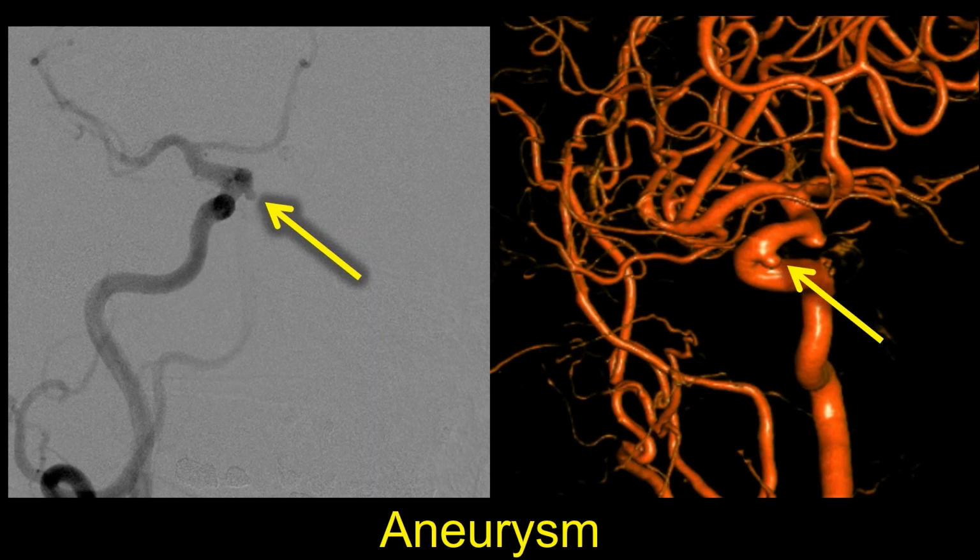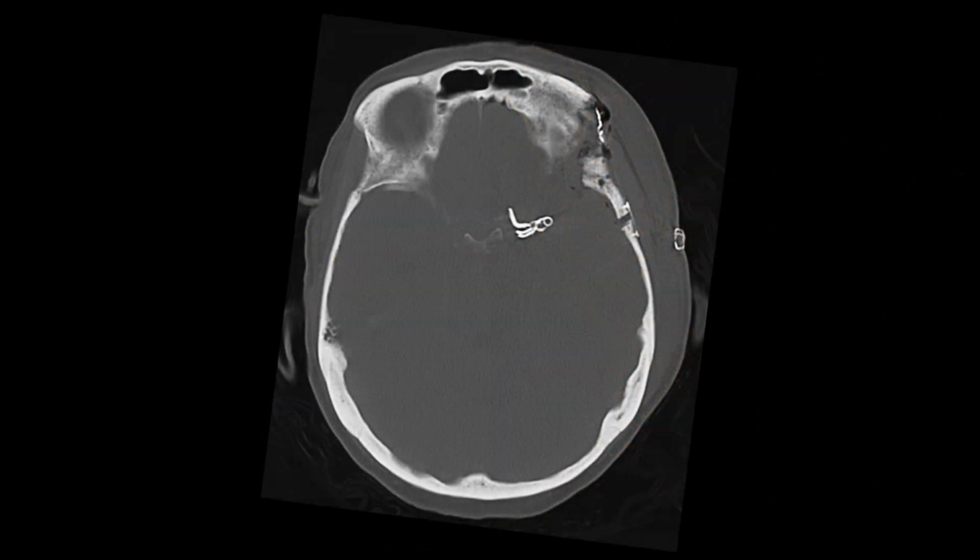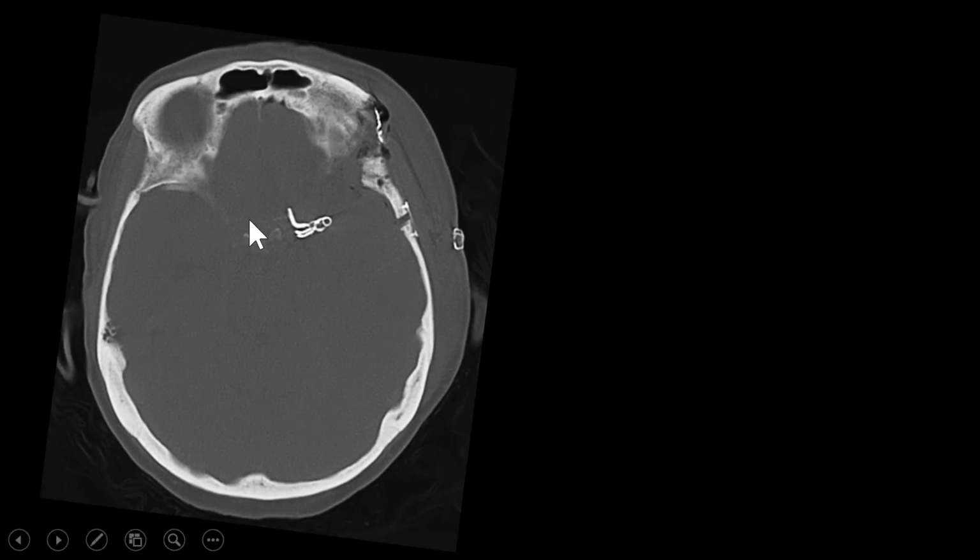It's an anterior view. And we see a little aneurysm the arrow is pointing to coming off the cavernous ICA. So they decided to go and do a big surgery on this to put a clip on. And the surgeon said that he got in there and got into towards the cavernous ICA. And as soon as he put the clip on, he said that the whole vessel was just friable and the vessel just fell apart and started filling up with blood at that level.